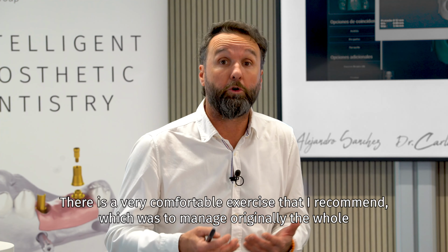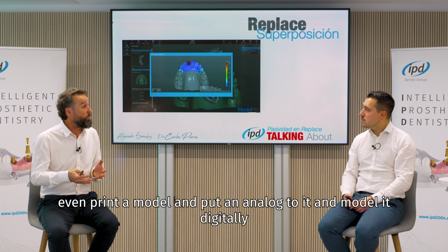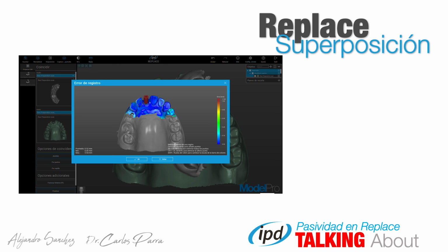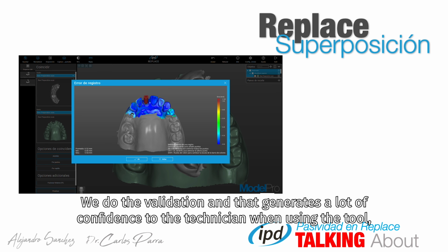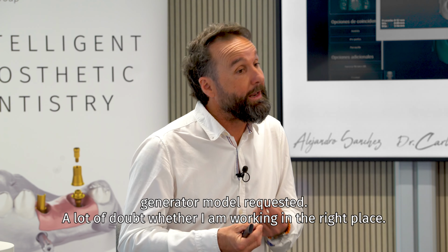There is a very comfortable exercise that I recommend, which is to manage the whole model as it arrives from origin, even print a model, put an analog in it and model it digitally, and then do what we see in the image: make the overlay of the IPD transformed image, manage it and compare the location of the connection. We do the validation, and that generates a lot of confidence in the technician when using the tool, because as we work a lot spatially, in many cases we also work virtually without a requested physical model.